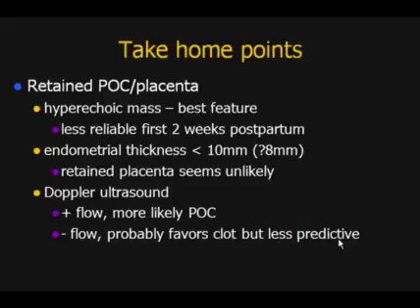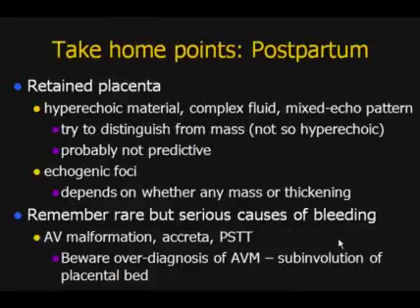Doppler ultrasound can certainly sway you. Seeing flow favors retained products. Lack of flow favors clot. So it can certainly push you one way or the other, but it doesn't seem that either is totally reliable at this point. For retained placenta, remember that hyperechoic material, complex fluid, can be difficult.